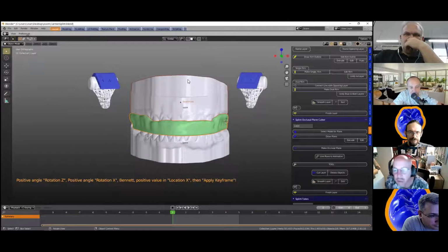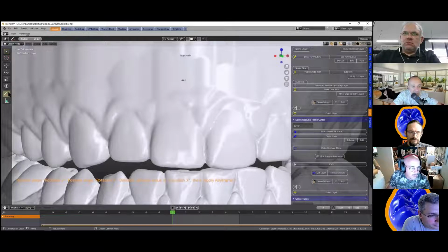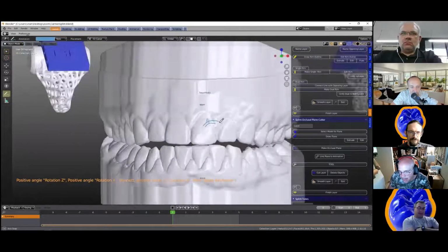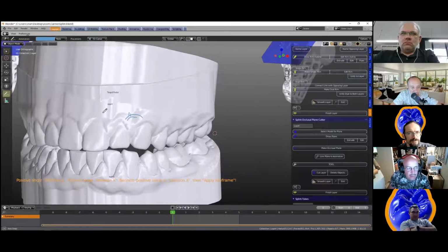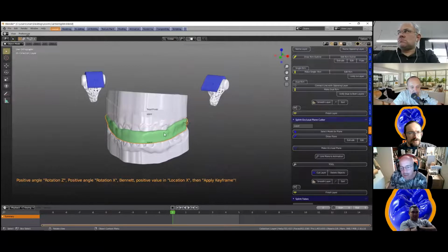So here we've got a fitting surface, which is the blocked out model. And if I look at the blocked out model carefully, we can actually detect where it has been blocked out. So we can see over here, for example, the survey line is here, and this is blocked out here. So the undercut, if you struggle with having a splint in position, you would need to bring that above that line. You can't really see it so well here, but when you're actually designing it, you'll be able to see this quite clearly. All right, so let's just take this away. And okay, so here's one, and we want to cut this out. So we're going to go.